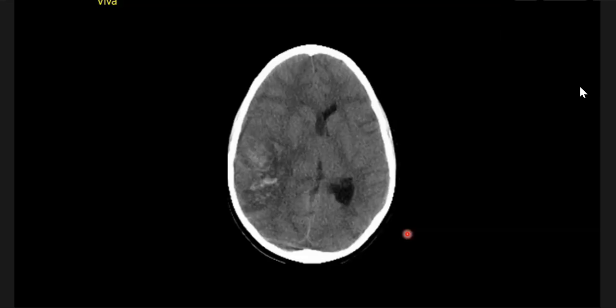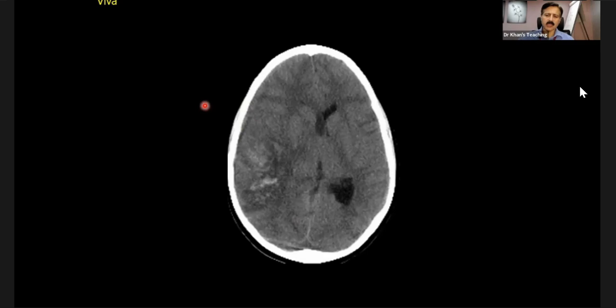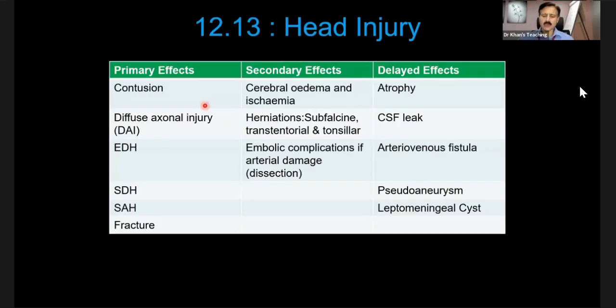So it's an intraventricular hematoma and intraparenchymal hematoma. There's also a suggestion of some isodense subdural as well on the right side. That is just an artifact. So you are calling it an intraparenchymal hematoma, correct? Yeah. Okay, so that is the point. Don't use this word.